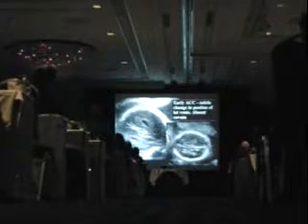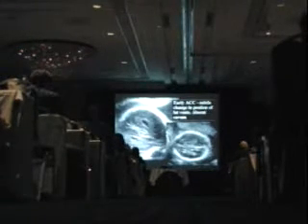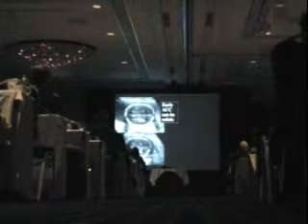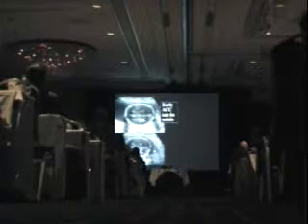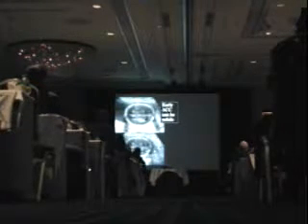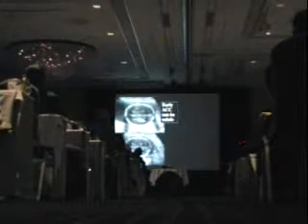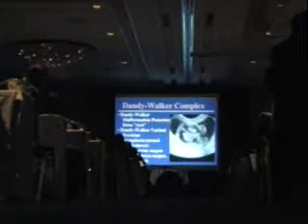The shape of the lateral ventricle is also a little bit of a colpocephaly type of shape, or a teardrop, but it's really the space between the frontal horns that sort of nails it. Here's another one. Again, the shape of the frontal horns, the space between them, which is too big, and the teardrop appearance of the lateral ventricles, and the MRI will also demonstrate the same thing.